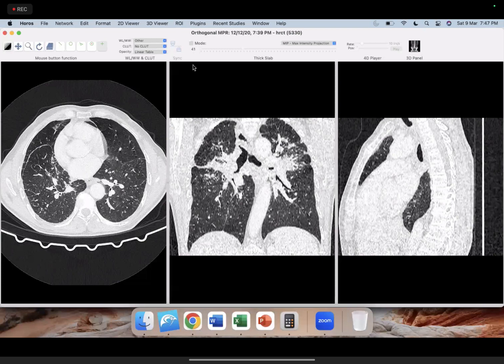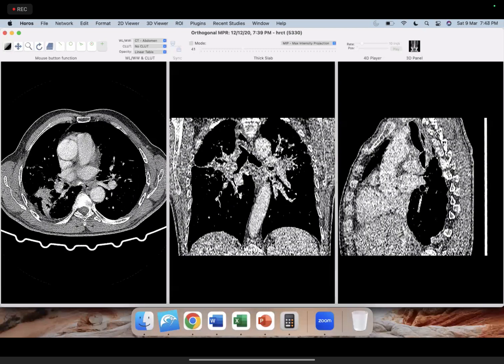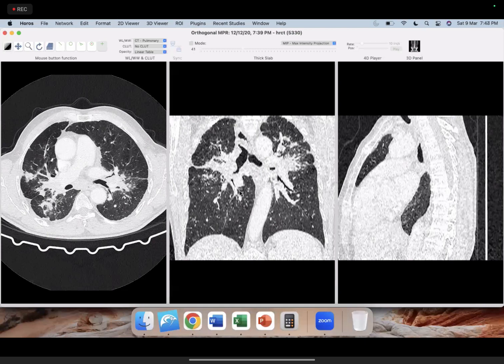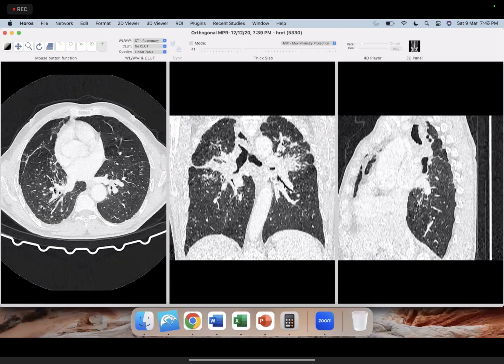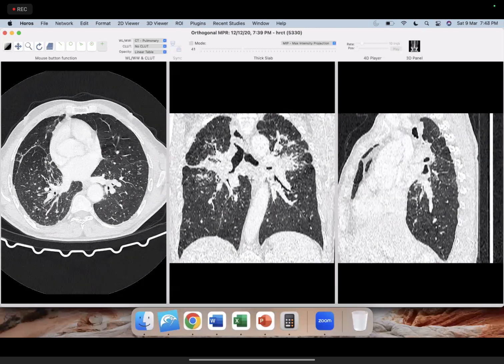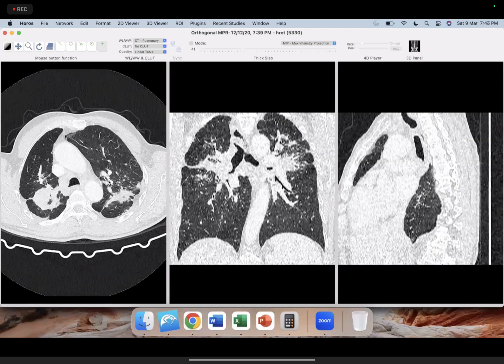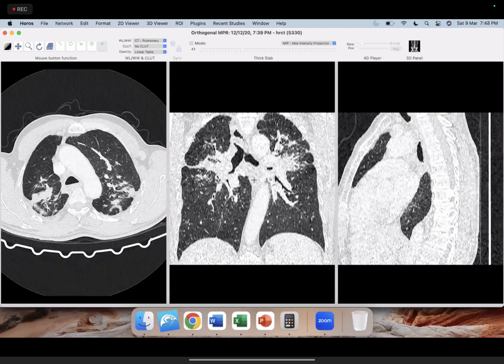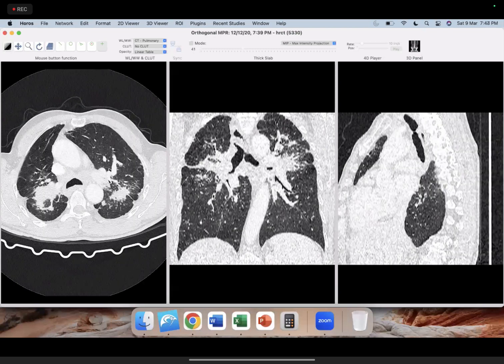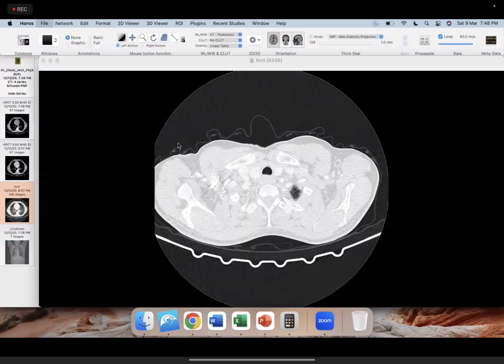Yes, now many of you have started getting the diagnosis right. And once you have the silica exposure confirmed, then you label this as silicosis, and these are nothing but part of progressive massive fibrosis. So remember, anytime you see randomly distributed nodules with high density, and always in general also keep a habit to ask about any CTD, smoking history, or even exposure history and occupation history for every patient. But at least even if you don't have, when you see this type of findings, always ask for that. So this is just to show as a differential for sarcoid. Many times these are also labeled as sarcoid, but remember this is nothing but silicosis.